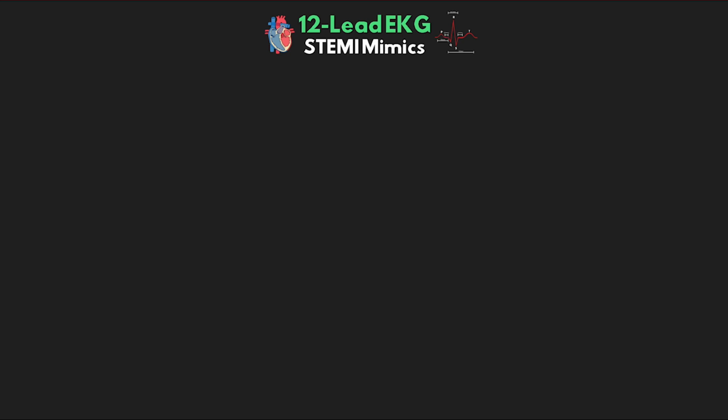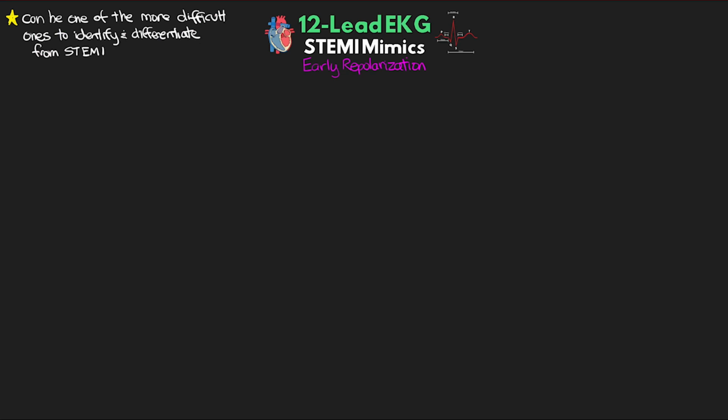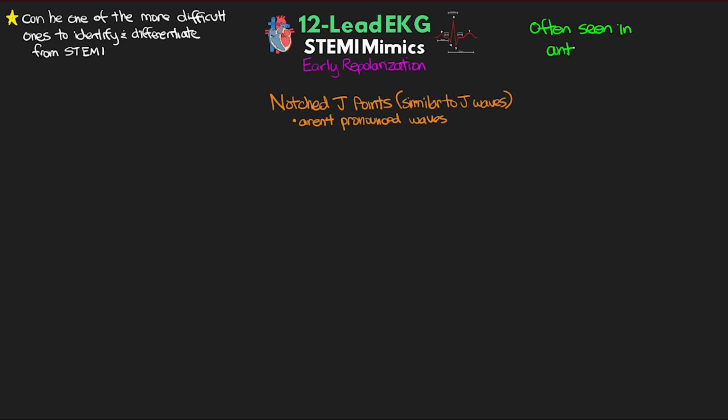All right, now let's move on and talk about benign early repolarization. And this can be one of the most confusing ones to identify and differentiate from STEMI. So similar to Osborne waves, with early repol, we're actually going to see something called notch J points that really aren't as pronounced waves like we see with the Osborne waves, but you will see something kind of similar. The morphology of the concave ST segment and the lack of any reciprocal changes is going to be key with this one, although we often will see this with our anterior leads, which we would not expect to see reciprocal changes because those would be happening posteriorly.